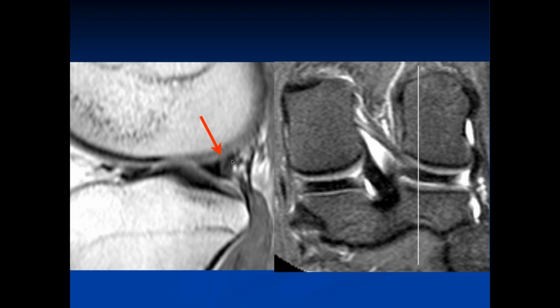So you need to follow this medially to see if this communicates with one of the capsular ligaments, in this case Wrisberg's, and then you've got to go more laterally to see if this goes away, as you would expect if it's just the interspace between the ligament and the meniscus.